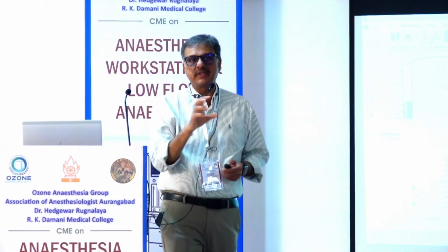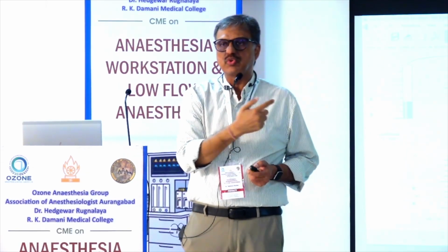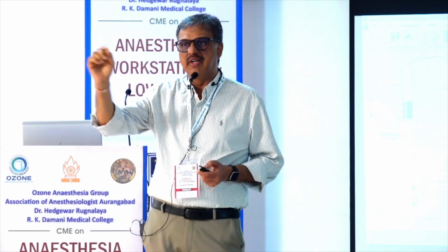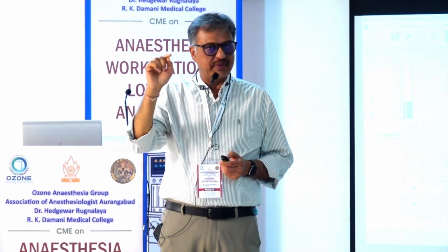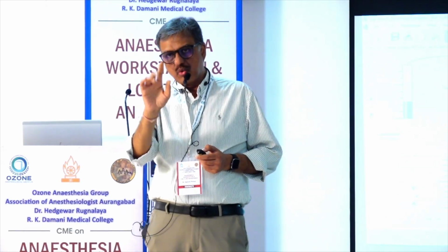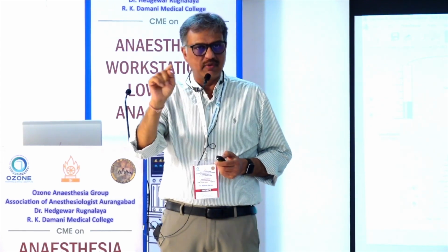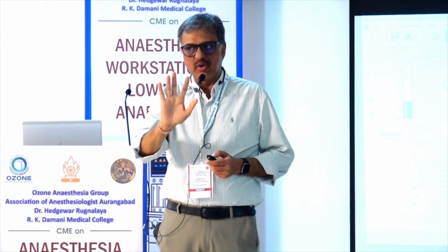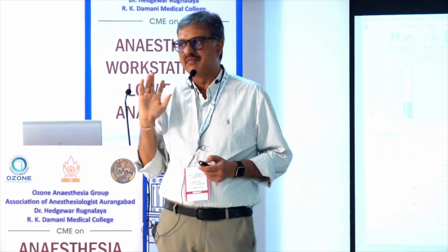So 34, see what this suggests. When the patient is taking up, this shows the vapor in the form of liters. At standard temperature and pressure, almost around 200 ml of vapor, for easy calculation, ideally 184, equals 1 ml of liquid.